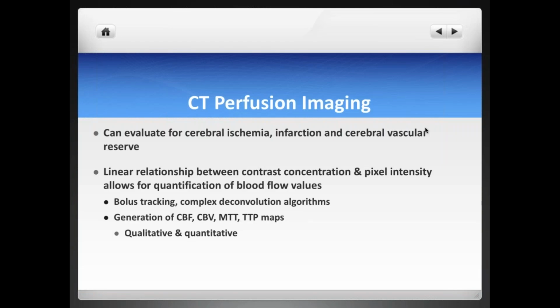Let's talk a little bit now about CT perfusion imaging. Very interesting with CT perfusion imaging. I think it became very popular probably a decade ago or so. Then it fell out of favor initially when the endovascular trials came out, just because a lot of people were saying, well, CT perfusion takes a long time to acquire, and we're getting very good outcomes by just looking at the CT ASPECTS score in the non-contrast head CT, and then looking at the CTA.